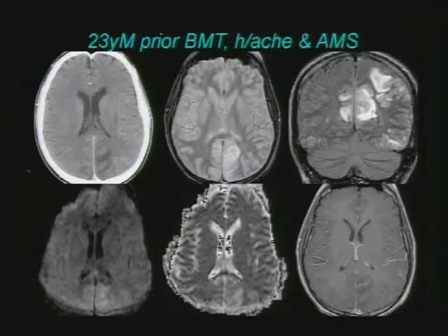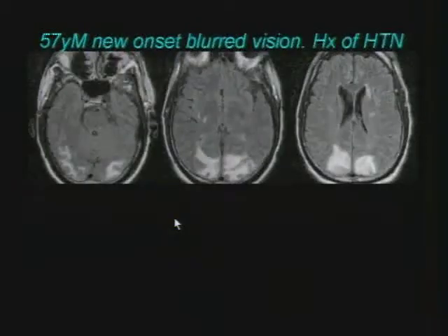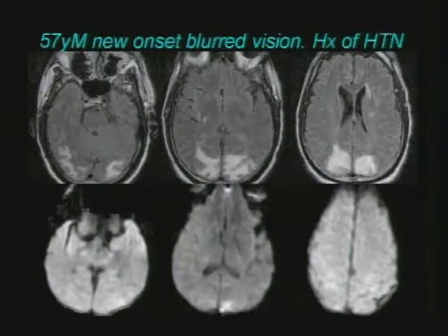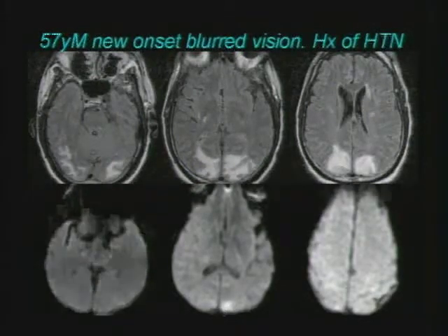It can involve the grey matter. You can see there's no restriction of diffusion, there's no real enhancement, just a lot of swelling, and this is another case of PRES, reversible. A man with new onset blurred vision and a history of severe hypertension, again predominantly subcortical white matter signal abnormality, bioccipital in this case. But on this patient's diffusion-weighted images, we do have an area of high signal abnormality.